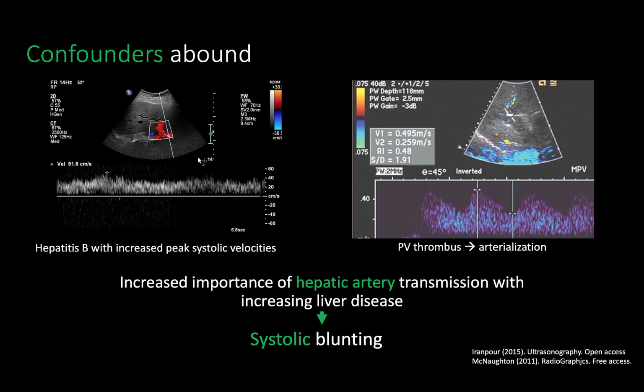Furthermore, young healthy subjects may have some pulsatility, particularly those with a low BMI. It is not clear if this represents direct contact transmission of aortic pulsations or venous transmission. Similarly, a dilated inferior vena cava is also a reported finding in this population. According to our experience, the hepatic vein waveform is normal in those patients.